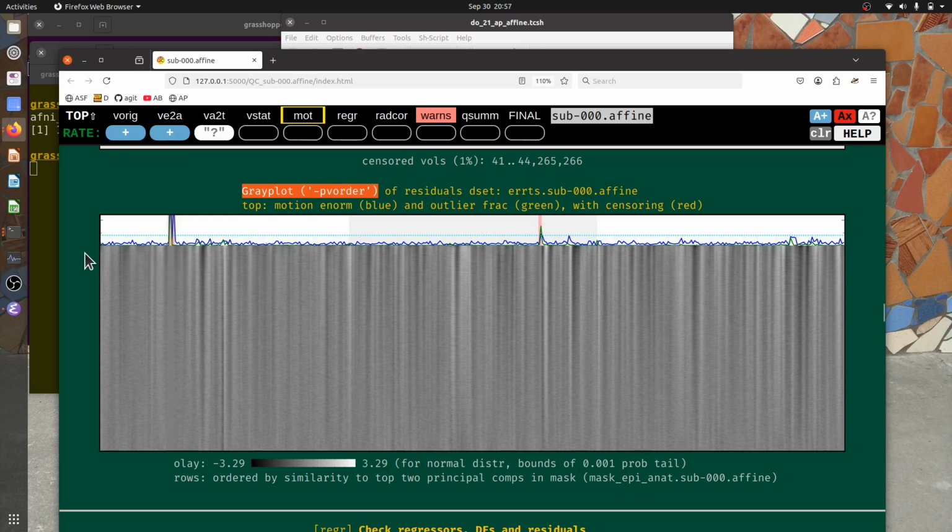If we didn't do that and we just took things spatially, reading line by line across the brain in 3 dimensions, it would look pretty messy and hard to see patterns. So this just helps accentuate patterns, where you see at a given time point whether there is a lot of one shade or gradation of shade.